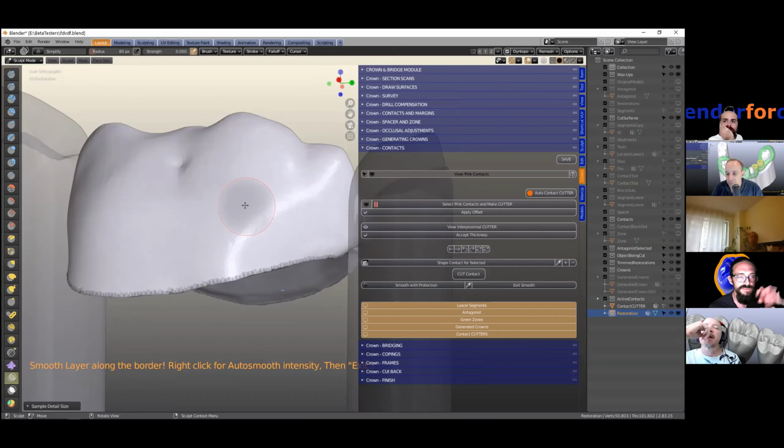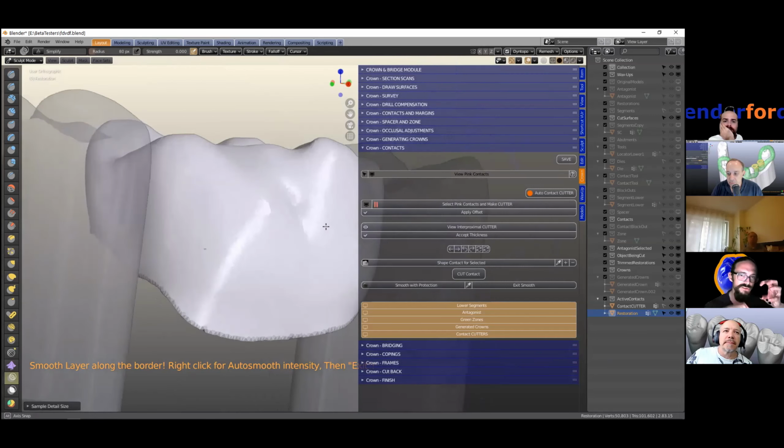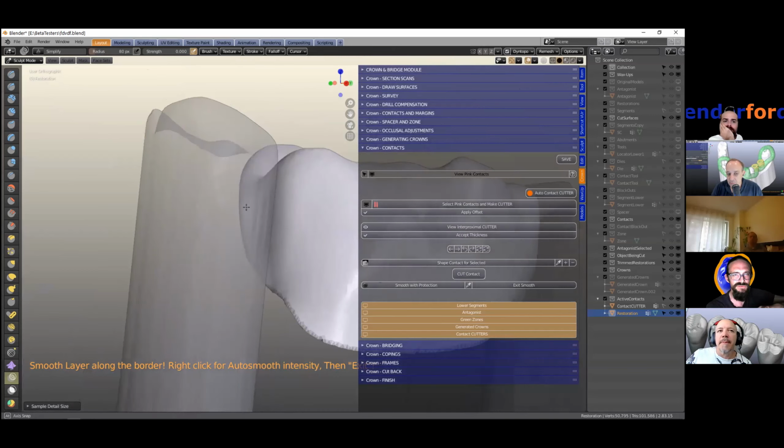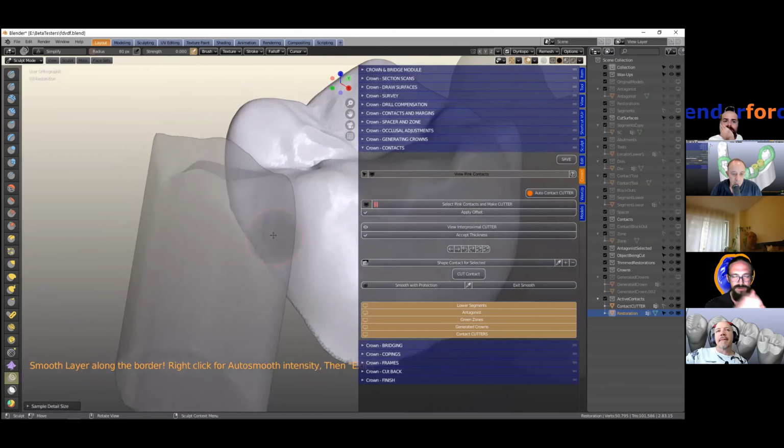So if we just manage to make a nice contact area, and afterwards what you are doing next is just trying to avoid the nice thing you have done, I think it will be quite disturbing for the sculptor, because when you are at the lab or in the clinic, you just do the other thing: we add and we remove. And there, I think it's very hard to make some nice convexities sculpting, even if we take some big tool and zoom out or make the tool bigger. I have issues making nice convexities.